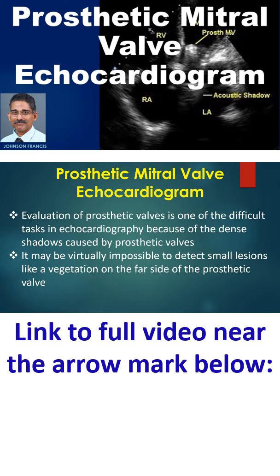Evaluation of prosthetic valves is one of the difficult tasks in echocardiography because of the dense shadows caused by prosthetic valves. It may be virtually impossible to detect small lesions like a vegetation on the far side of the prosthetic valve.